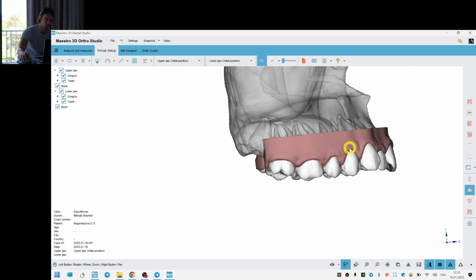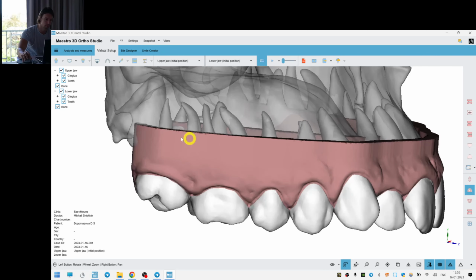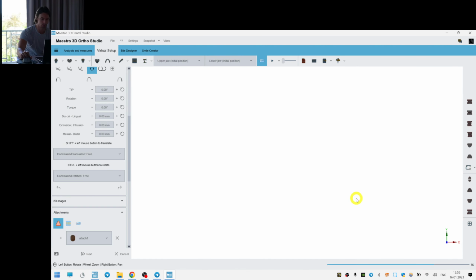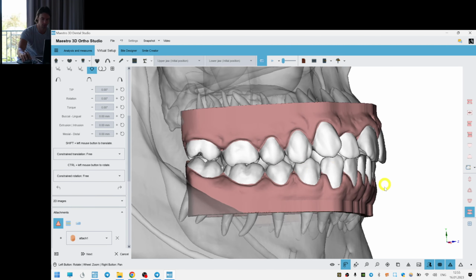There are third molars. They don't persist on the scans, but you can see the signs of them on the CBCT scan. So if we choose this option, this treatment plan with distalization, we need to get rid of the third molars before we start.